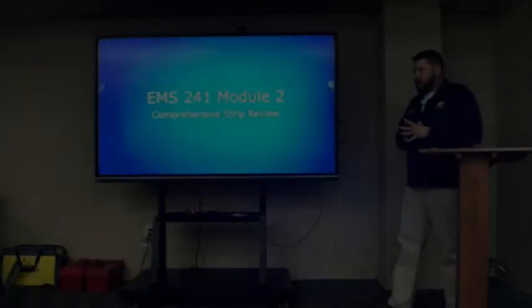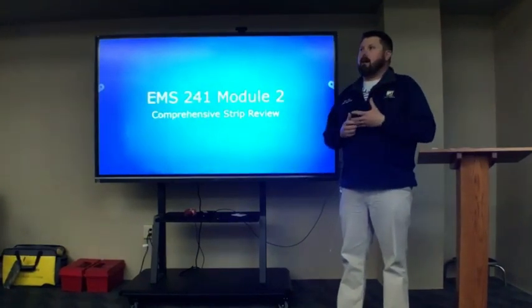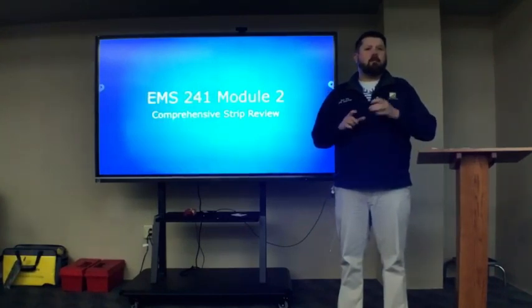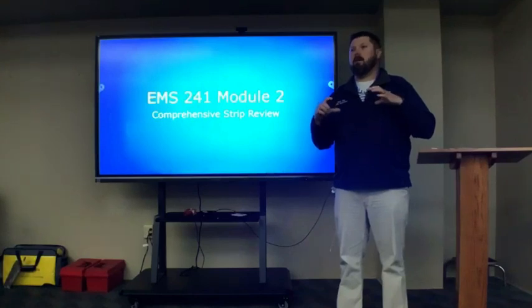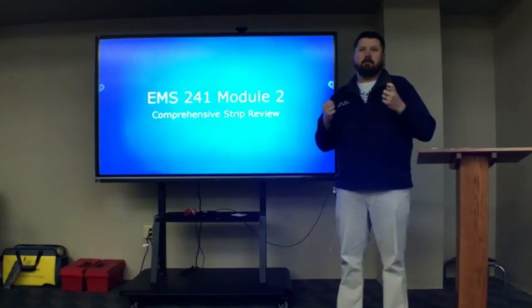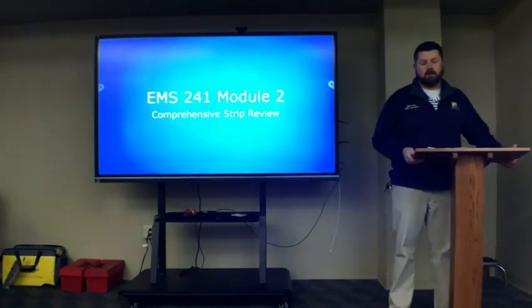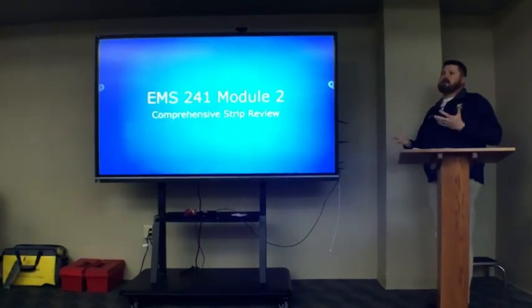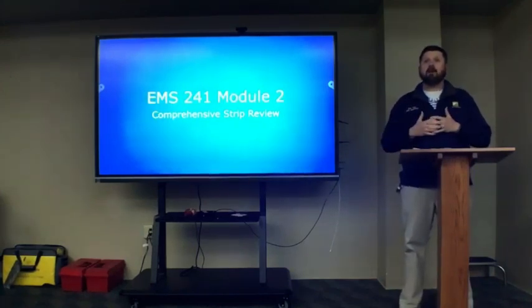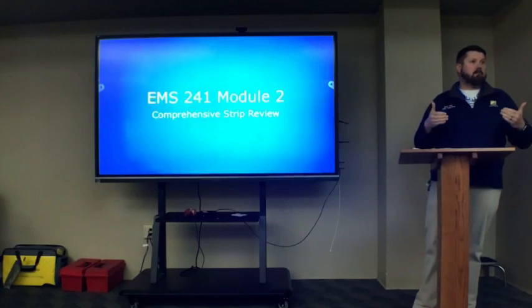Module 2, we covered the arrhythmias that we are going to be looking at for your test. One thing to remember is that all of your arrhythmias, like the ones you're doing on your paper, are in what lead? Lead 2. Why? Because it gets a natural flow. The axis of the positive electrode is much closer as far as the angle goes. One of the good things about lead 2 is that it can give us at least a quick look if we've got a lethal arrhythmia or something else. Of course, we're always going to do a 12 lead after we notice something that's cardiac centered.